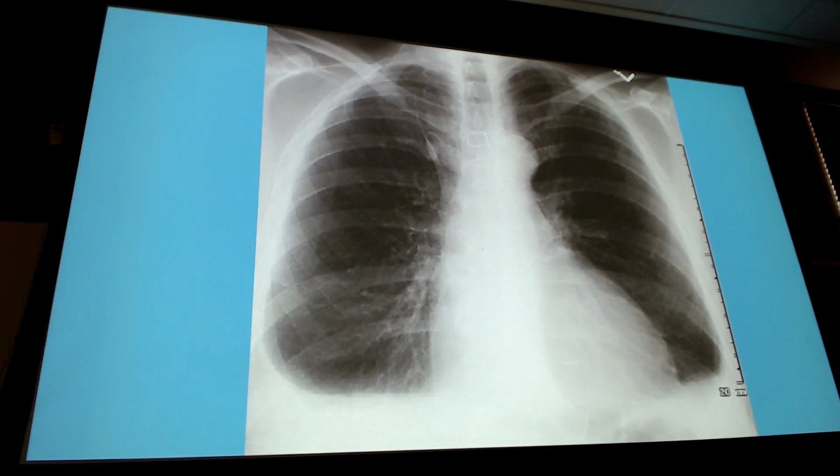I will tell you there are other things on this x-ray that are slightly abnormal as well. I don't think the clavicles are very rotated. They look like they come in right here, the sternal area here, the edges are here. My spinous processes are fairly centered, so maybe a little bit, but nothing that stands out majorly. Yes, the sternotomy wires. Is there a fusion up on the upper right there? What are you looking at? That thing, yeah. That guy right there. And I also heard that's a big heart. Good, we're getting it from different areas.